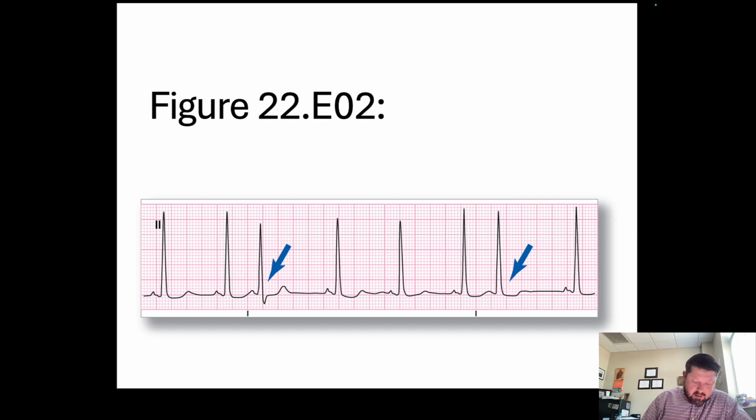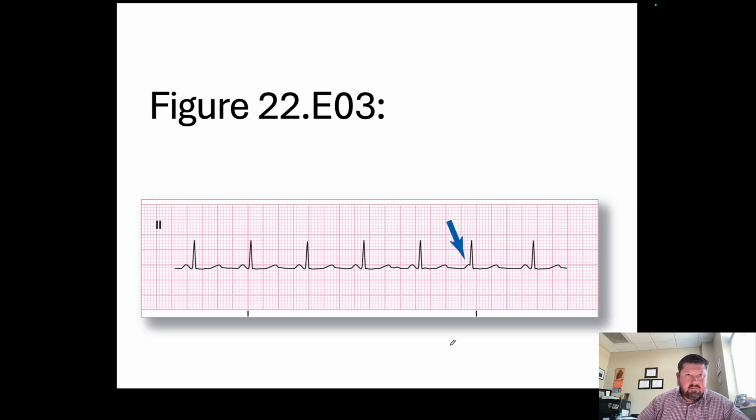So in this case here, I note that this is not a P wave right here, because I see that I've got this scoop here and the scoop here. So that's actually a T wave, but there's no fusion of the P wave right there. And so this is a T wave too that kind of goes into that complex. But what you've got here is an irregular rhythm with sinus, because you've got underlying P waves with PJCs.